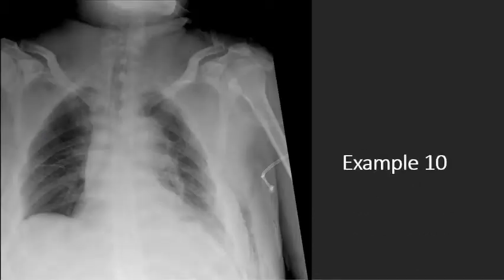So this right here is an important part, because with critical care, it's very important to understand what you're doing and where your things are. So this patient is malrotated. It's hyperexposed. You see that these lungs do not look normal. The left is hyperinflated or hypoinflated. The right is kind of normal, but you really can't see much. It's just not a very good film.